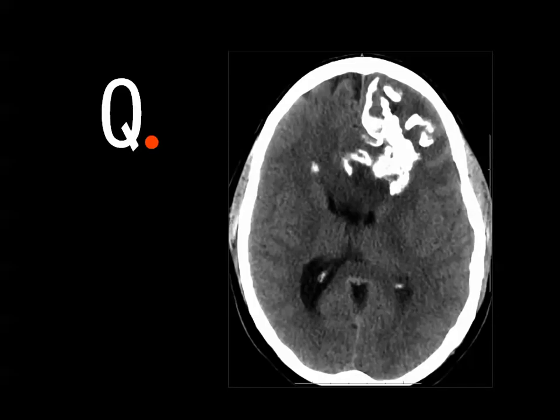Non-contrast CT or contrast enhanced CT scan of the brain showing this is enhancement. This is calcium. It looks similar to the calvarial bones. And this is a densely calcified space-occupying lesion in the left frontal lobe, surrounded by some perifocal brain edema compressing the ventricles.